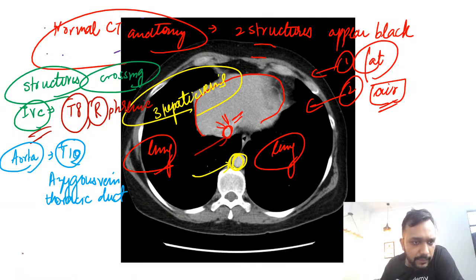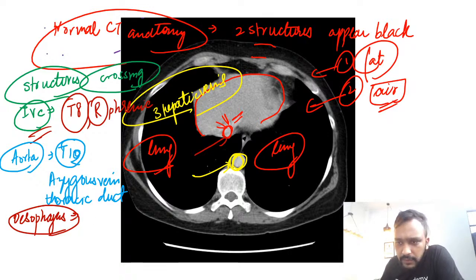And tell me, your esophagus. Esophagus crosses the diaphragm at what level? Anyone, guys?